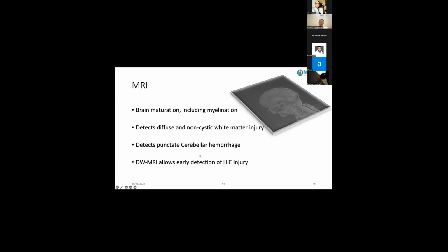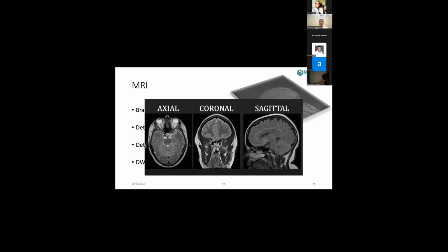Why? Let's discuss that. Again, these are the different cuts: the axial, coronal, and sagittal. I'm sure you guys are experts on this already. But the sagittal section looks like this. We know that. And that's how the coronal looks. Axial, you don't do many on the cranial ultrasound except for the mastoid and the temporal views. But it is just cutting the axial section of the brain.